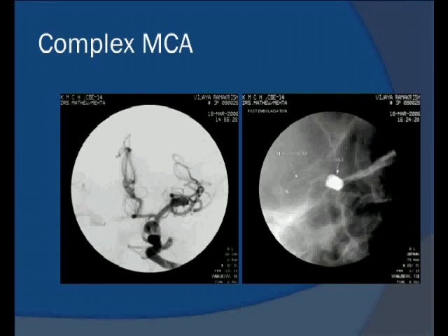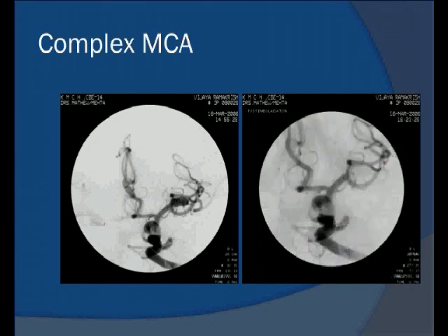Here is another example where a 3D angiogram makes a huge difference. It's a patient who's got an aneurysm coming from the MCA trifurcation. There are 3 vessels that will be coming out on this point, or very often 2 vessels, and until we plan the treatment in such a way that this vessel is protected, we can lose this and have a very large territory stroke, which can often prove fatal, or if not, the patient ends up with a very large deficit.